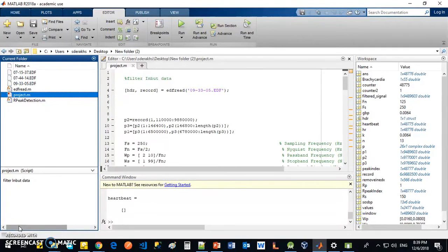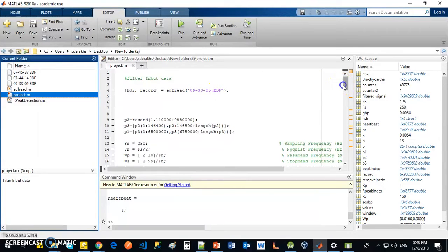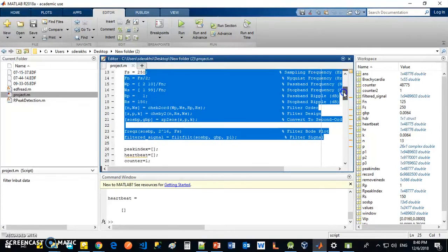In this project, we want to detect and predict bradycardia. To do this, we are using an ECG sensor which detects the heartbeats inside the human body. At first, we read the file created by this sensor with the special library edfread, which reads EDF files. And then we are using a filter to remove the noise and clean the data and prepare it for the next section.